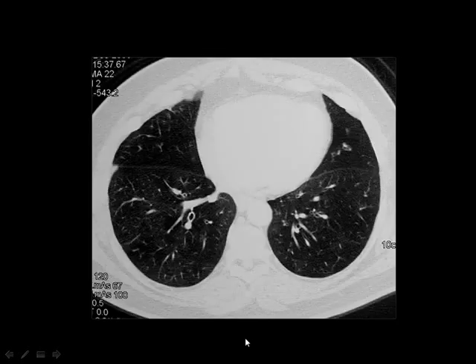right lower lobe. Then can you see this fissure? It's almost exactly at the side of the line I drew. This fissure separates an anterior third from the posterior 2/3 at the level of the cardiac shadow. This area represents the middle lobe, and this area the lingula, and this one right lower lobe, and this one left lower lobe, and this one lower lobe also. This is the right lower lobe also.